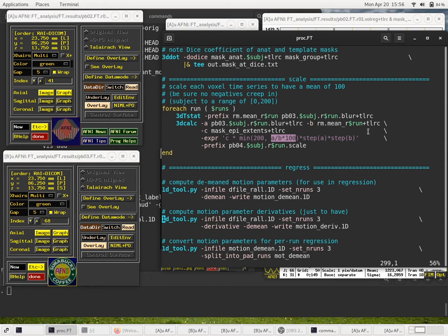And then we just do a little other clipping to make sure we're not dealing with weird values. So if the mean is going to be 100, we don't care about values that are greater than 200. So we clip them so that we never exceed 200. We take the minimum of 200 and the actual value we care about.